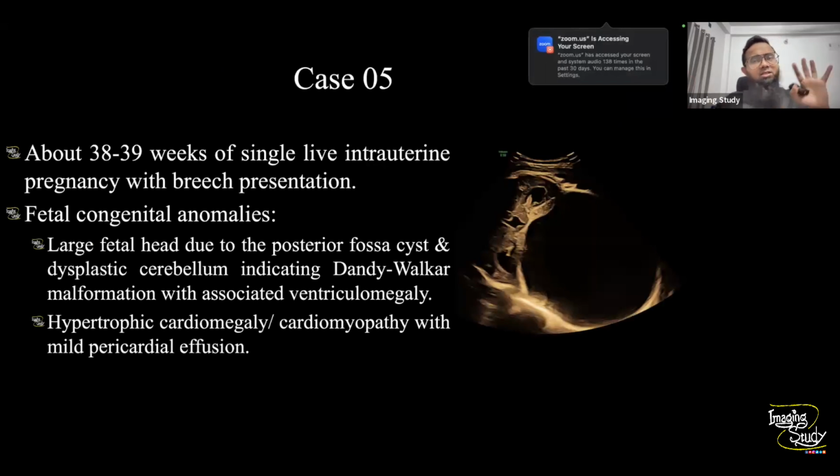Anyway, so this is a long case, and now you can see this is a 38 to 39 weeks single live intrauterine pregnancy with breech presentation. We found some fetal congenital abnormalities. There was a large fetal head due to the posterior fossa cyst and dysplastic cerebellum, indicating a case of Dandy-Walker malformation with associated ventriculomegaly. So there was hypertrophic cardiomegaly or cardiomyopathy.